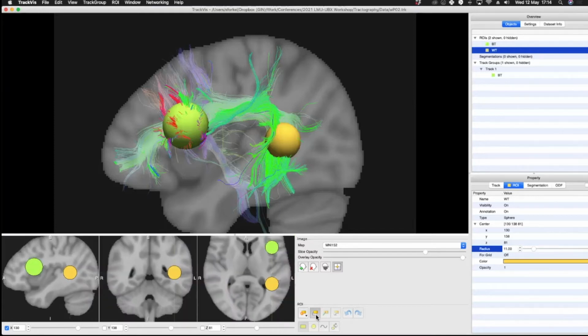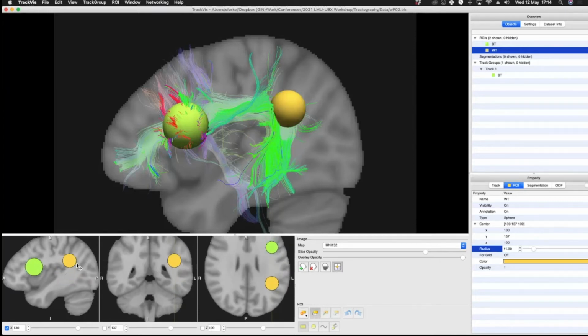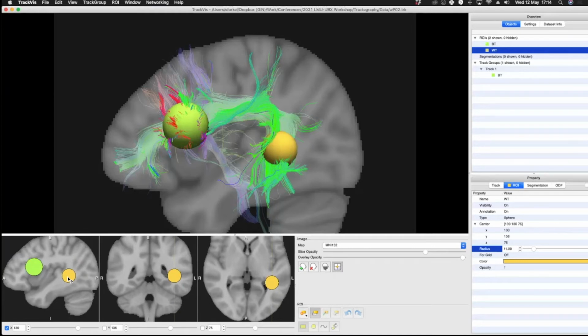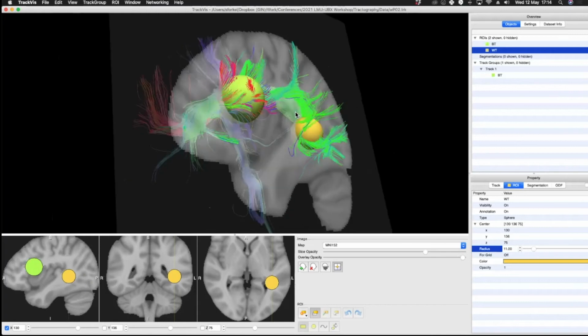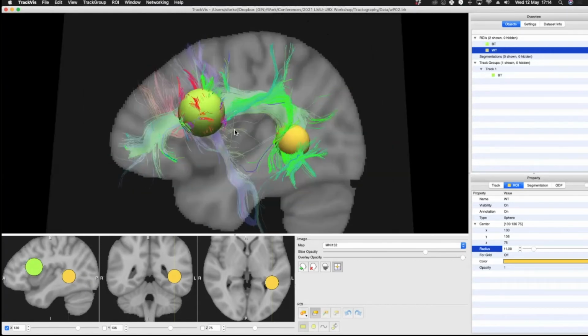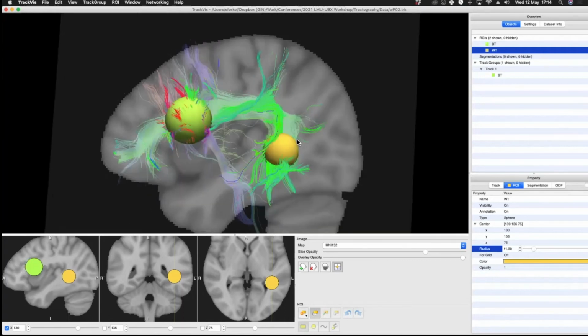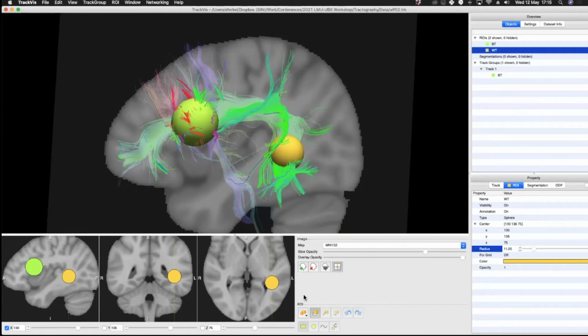Now, just to demonstrate to you, I have the move option selected. So what happens is if I grab it, I just move my region along. So don't do that. I'm just showing you. Now place it back where it belongs, posterior temporal, behind the transverse gyrus. And because we already reconstructed it from Broca's region, you can also see that we are indeed perfectly placed onto arcuate connections here. So we're missing one more region.